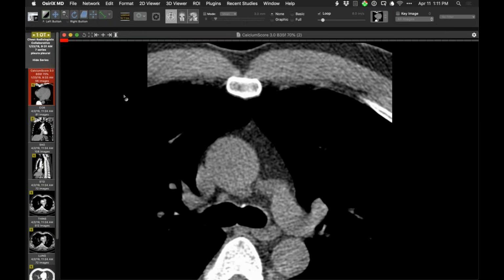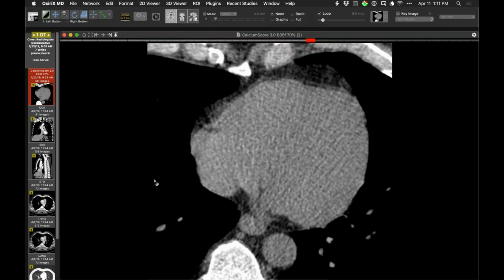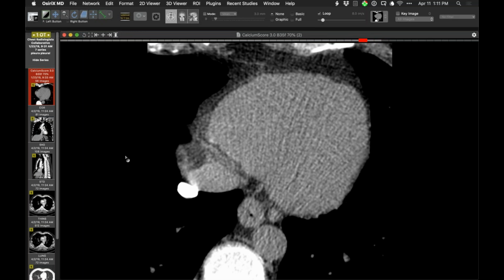So I get a CT and it says follow-up nodule. And I look at the previous CT, where was the nodule, where was it found? Turns out it was found on a calcium scoring cardiac CT. And the reporter simply said there is this calcified nodule in the basal right hemithorax. Didn't recommend a follow-up, just described it as such. And then I thought, okay, they decided to follow it up.